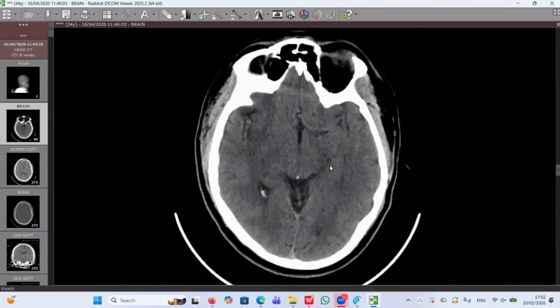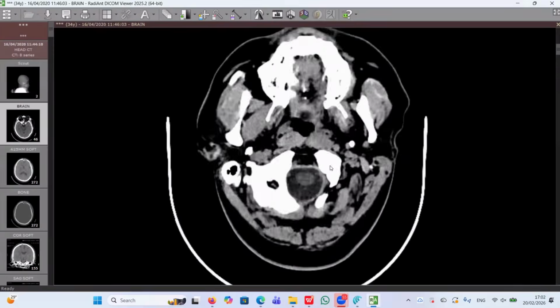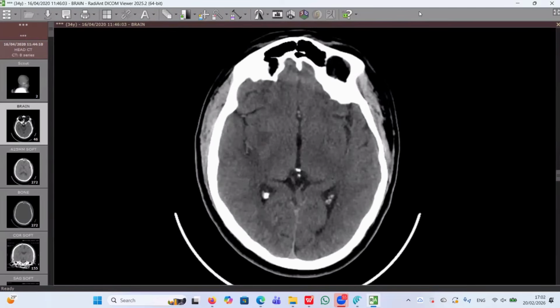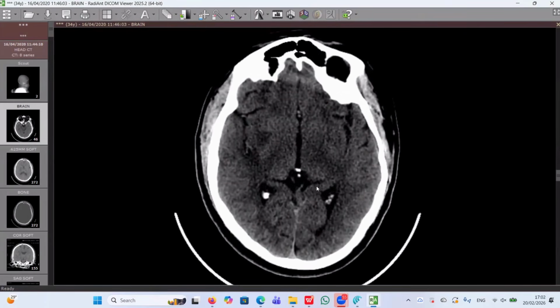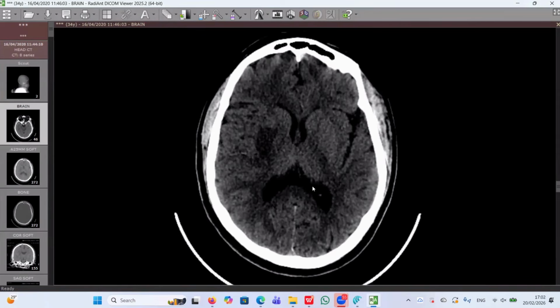For any case coming to the ER, you should first scroll the CT brain as you did. And please, I want to see the stroke window. It's grainy, but it's diagnostic. Look for the abnormality here. It's very easy to see, located at the right basal ganglia, right lentiform nucleus. This is normal, and this is abnormal.